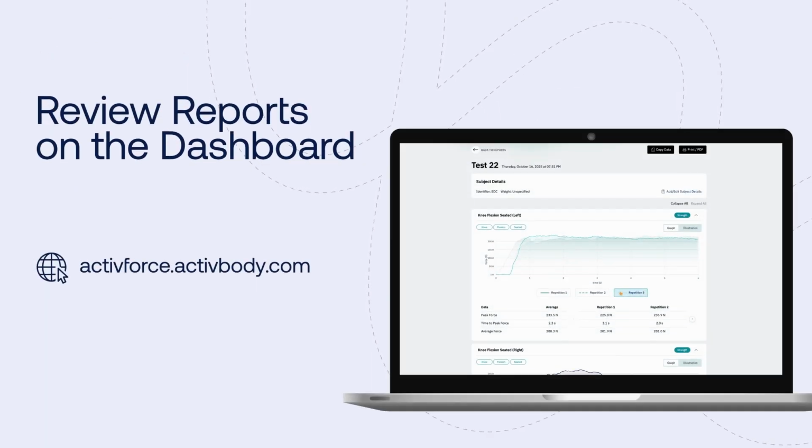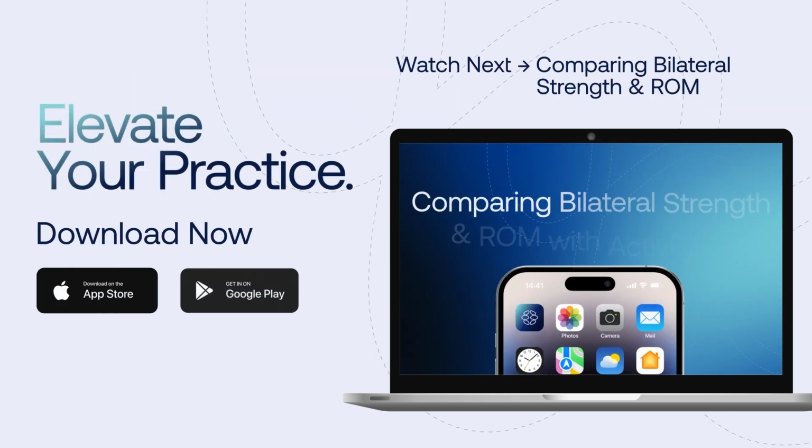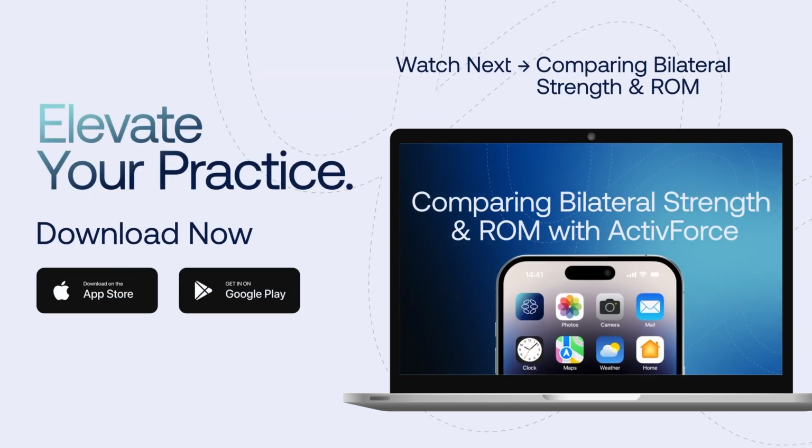View the full session report on the web dashboard. Get accurate results, consistent data, and complete reports, all within the ActivForce app.